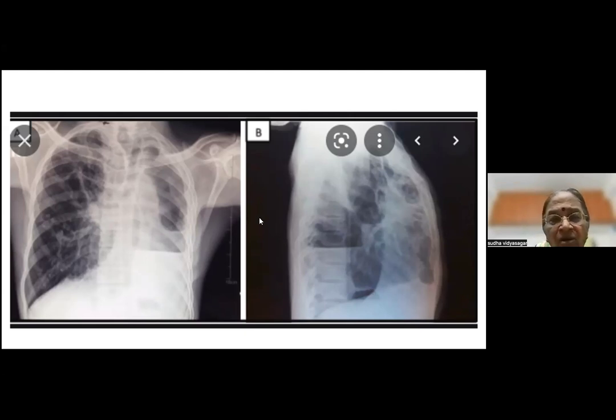Okay, fine. Now, always this confusion will come. Is it a large cavity with a lung abscess? You got a straight line there. Is it a large cavity with the fluid, or is it a hydropneumothorax or a pneumothorax or whatever it is? Now, one thing you must remember is a lung abscess will respect lobar boundaries. You can't get a lung abscess going upper lobe and lower lobe, right? It's going to form in one lobe. But if in your clinical findings, you got findings that go through the chest, anterior, lateral, and posterior, then you would call it a hydropneumothorax rather than an abscess.